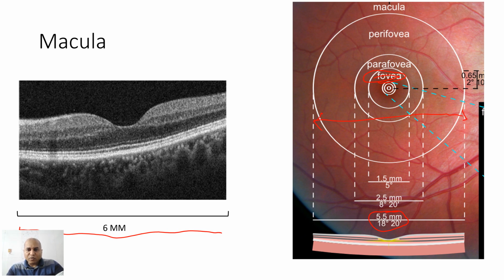So an OCT provides you an image which gives you the detail of this particular area. This will vary, because depending on the optics of the eye and the refractive status of the person, magnification or minification may occur, which can cause some changes.